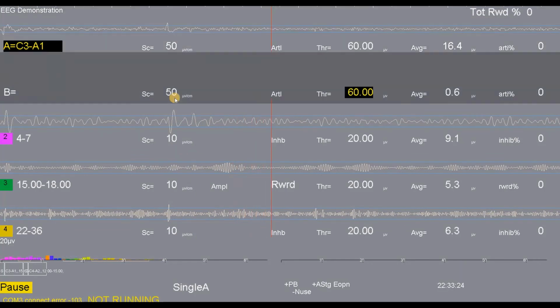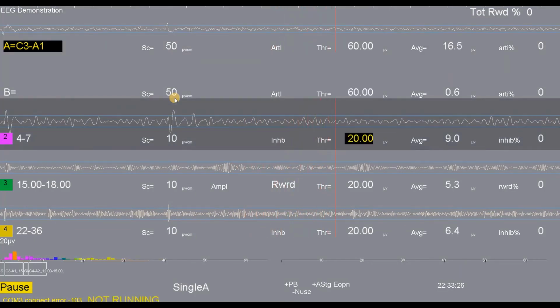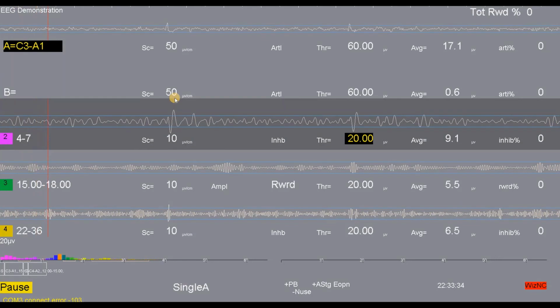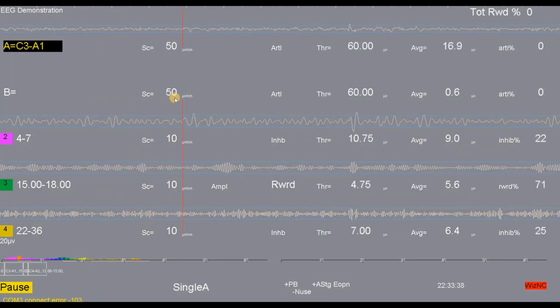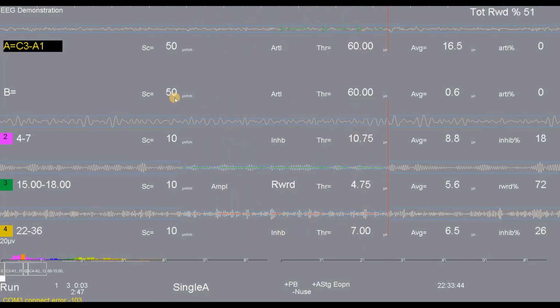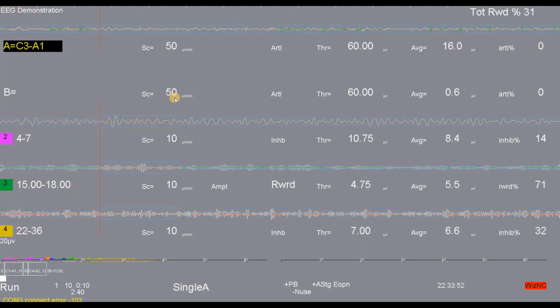What you want to do at this point is what you would normally do to run a neurofeedback session. Obviously, you're not going to check impedance, nobody's plugged in, but you still want to change the thresholds. So you would press F11 to adjust the thresholds, and then you would press F5 to start the session. And over here, I'm seeing the beautiful display of Orb. I hope you're all very jealous because I can see what's going on and you don't get to see it. And it looks pretty cool.